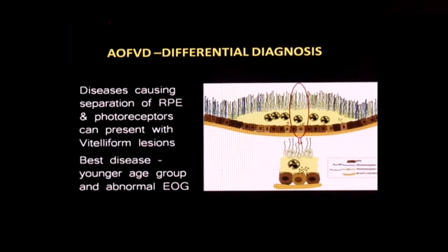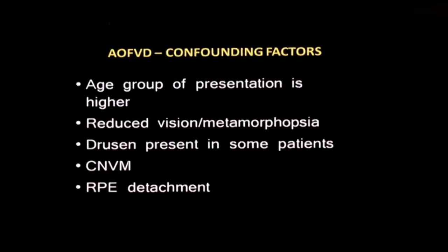But continuously going on into the disease, there is both atrophy and death of the photoreceptors as well as the RPE cells. And that's when you see the collapse stage. So this is an example where you're visualizing the pathology with your imaging techniques.